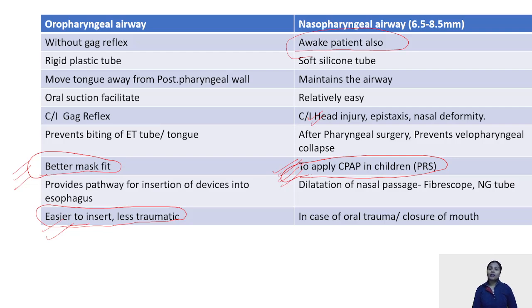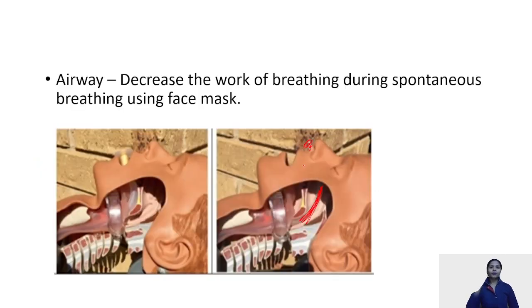Done. Plus, they can be used in those cases in which the oropharyngeal airway cannot be inserted, like oral trauma or restricted mouth opening. In those cases, in oromaxillofacial surgery cases in which the nasal patency is proper, the NPA is preferred because generally the mouth opening is restricted.